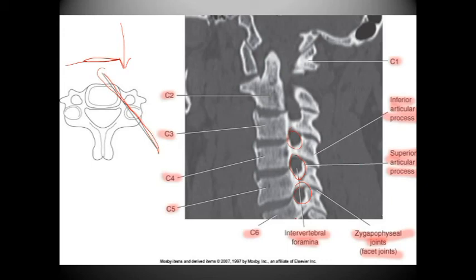And one thing I want to add is that on your best day of shooting an oblique cervical spine, you have probably never got your intervertebral foramina to look like this. You've never seen them in this kind of definition. And so that's why CT has kind of taken the wind out of the sails for traditional routine conventional radiography in terms of cervical imaging, because we can actually see all of this in a higher degree of detail and do it probably at the same rate that we could get all these pictures shot for the cervical spine.